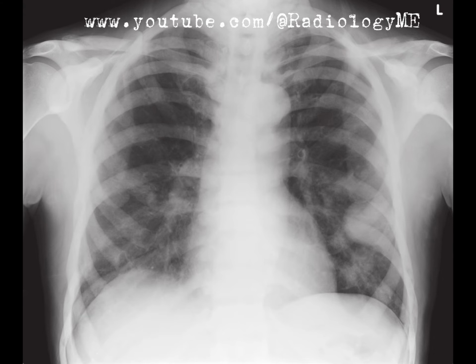It's also important to rule out metabolic causes. For instance, renal osteodystrophy associated with secondary hyperparathyroidism could result in diffuse bony sclerosis. If the patient had renal failure, we might also expect to see other findings like soft tissue calcifications or a dialysis catheter. But without those features, I think we're more likely dealing with a neoplastic process. So, given the findings here, diffuse bony sclerosis and multiple pulmonary nodules, the most likely diagnosis would be metastatic prostate cancer in a male patient or metastatic breast cancer in a female patient.